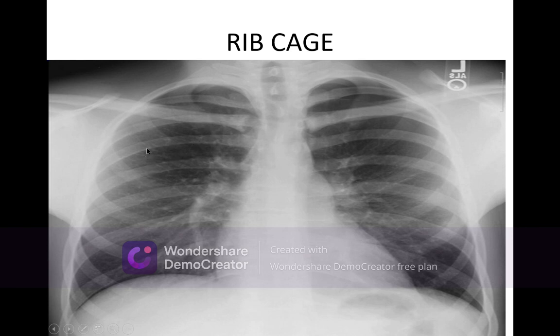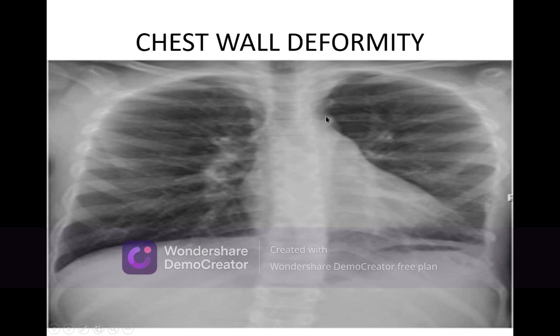So the upper border and lower border should be very symmetrical. Very, very regular borders they are. Inside any of this, there is nothing seen. This is a normal thing in any X-ray. Look, the scapula here. Here is the lateral border, which is outside, a correct X-ray position. It is not under this. So, this is about the rib cage.